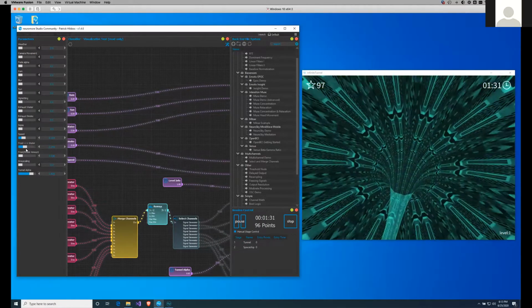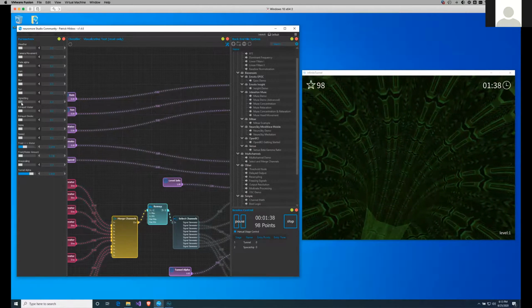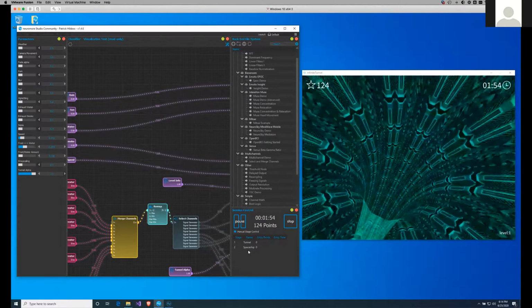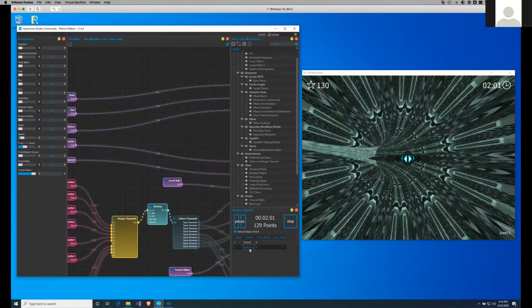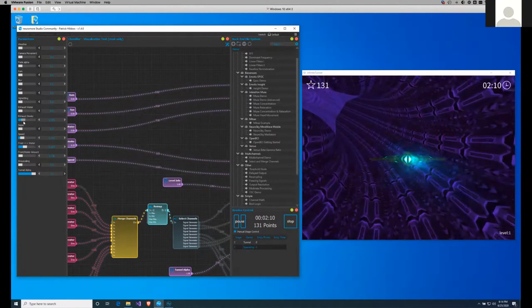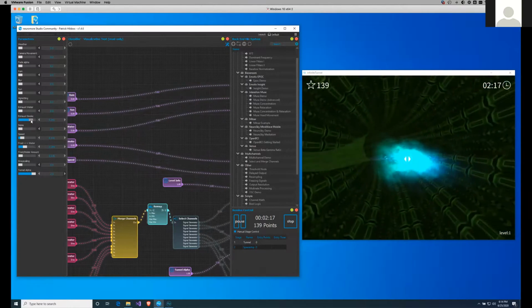And what's also available in all of the visualizations that we have is vignetting, which means we just zoom in the camera here. So it's kind of like that frost, I think, but instead of ice, it will be just blacked out. So the second stage in that particular tunnel is spaceship. If we enable spaceship, now there's the spaceship. It's kind of the same thing, but maybe a little bit nicer because it's not just a tunnel. There's also a spaceship. And with the spaceship, we also have another parameter that we can control, and it's the exhaust smoke of the particular tunnel.